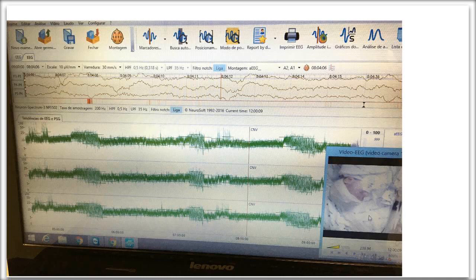Sometimes, if we have long electrode distances, we may see an elevated margin, and if we look at P3, P4, because they're closer, sometimes we see something different. But in this case, it stays pretty true all the way through, which is also interesting, but it is what it is. What can we do about it? It's still normal. And Gabriel's saying at first he was on CPAP and then conventional, so no high frequency disruption.